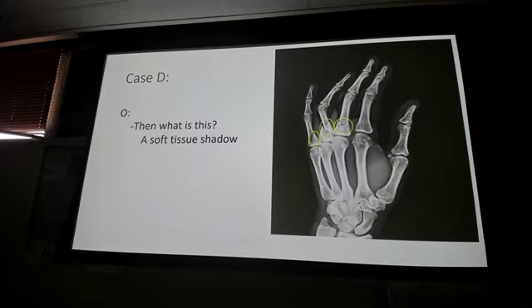That could easily look like a fracture if you didn't do your systematic process and follow your soft tissue to make sure. That is the soft tissue of the fourth digit coming down over the bone, causing a difference in that shadow. Right there. That is a soft tissue shadow. That is not a fracture. Easy way to confirm that in clinic, you can do it just from image.